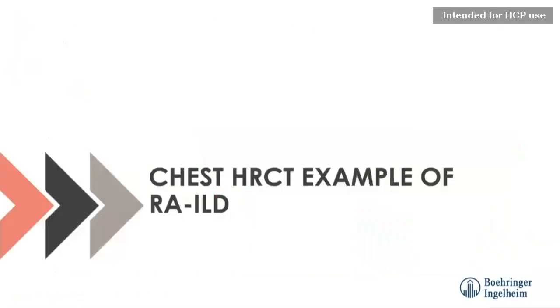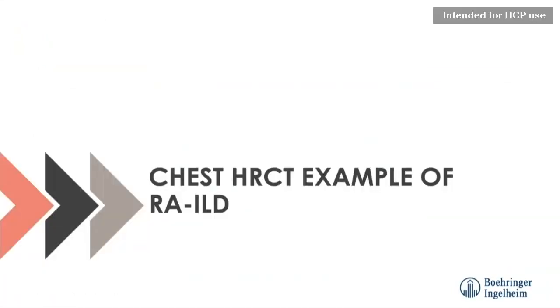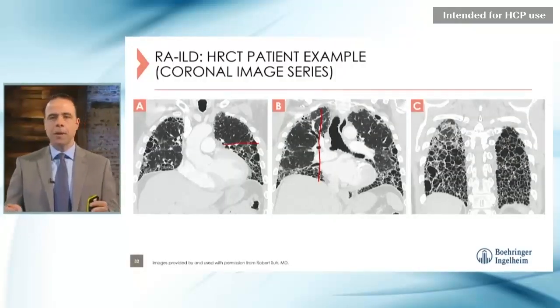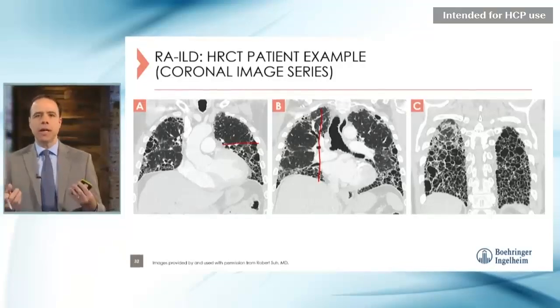And if we contrast this case, to keep this in your mind, the size from here to here, and then let's go back to Rob's case. Look how large this hemithorax is. This patient doesn't have a lot of fibrosis yet, doesn't have restriction, or not nearly as much as this patient. This patient, you can see the lungs are physically getting smaller. That diaphragm is getting pulled up. Those airways are getting pulled open. This is a fibrotic patient whose so much lung is being taken up that they cannot expand their chest to pull in air and oxygenate.